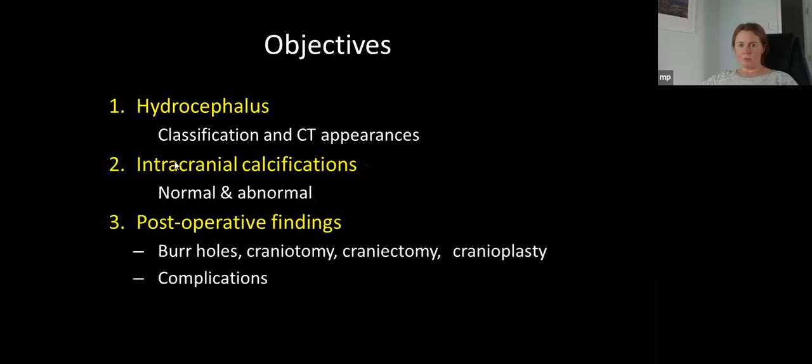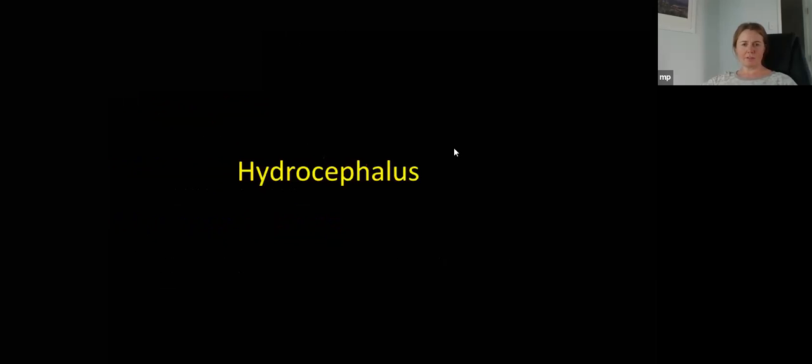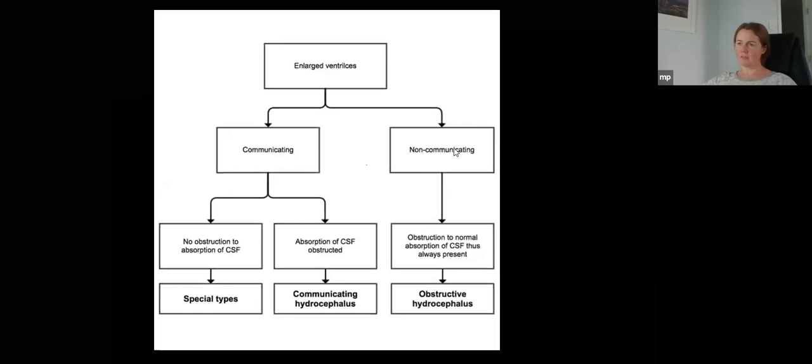So today, as I say, for those who have just joined, we're going to split the session into 2 40-minute sessions. So hydrocephalus, well, we can split hydrocephalus down into these broad categories. So starting at the top, enlarged ventricles.